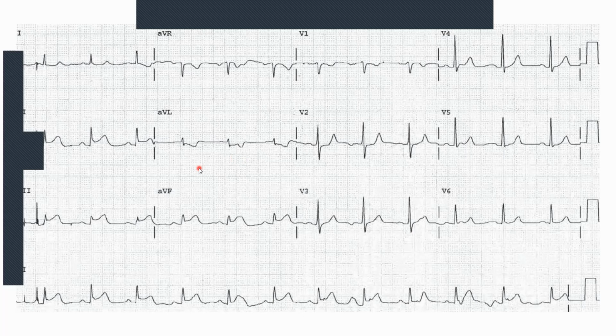So if you were to treat this patient as an inferior infarct with ST elevation and reciprocal changes, that would be perfectly fine. The one thing that's just a bit off-putting is the V2. And even the V1 here, you can see there's a slight depression. And here we've got, like I said, the slight elevations. And we know that we've got inferior and right-hand side, and the posterior part of the heart is also part of that arterial network. So there is a possibility that we've got a posterior infarct as well.